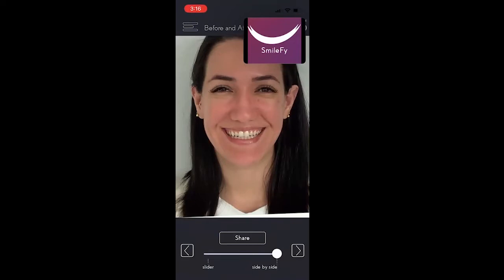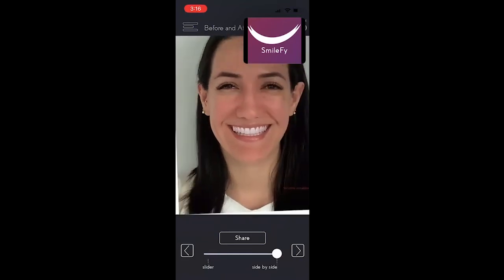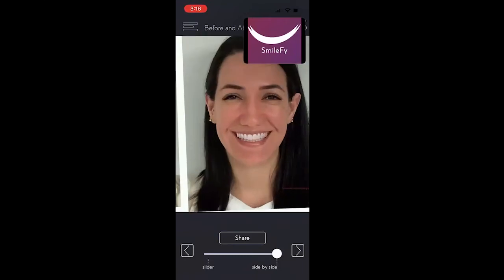The patient was very happy with the simulation itself, but as I was mentioning before, this is just a simulation of the patient's treatment, so I cannot use it as a base for the entire treatment. For that, I need to create a 3D dental treatment plan.